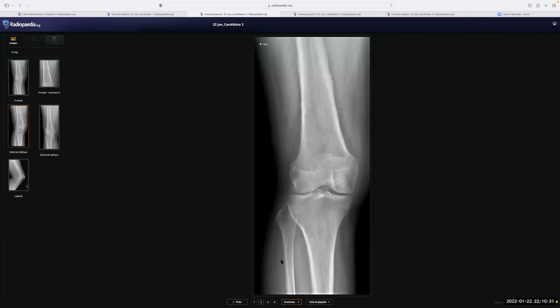So this is a case of hypertrophic osteoarthropathy. Right, okay. The bony texture itself is normal. So like you said, you focused on the periosteal reaction, but then you ignored it later on. But it's present in all bones. So this rules out at least that the abnormality is a primary osseous one, being seen in three different bones. That's what I want to say. True. Understood.